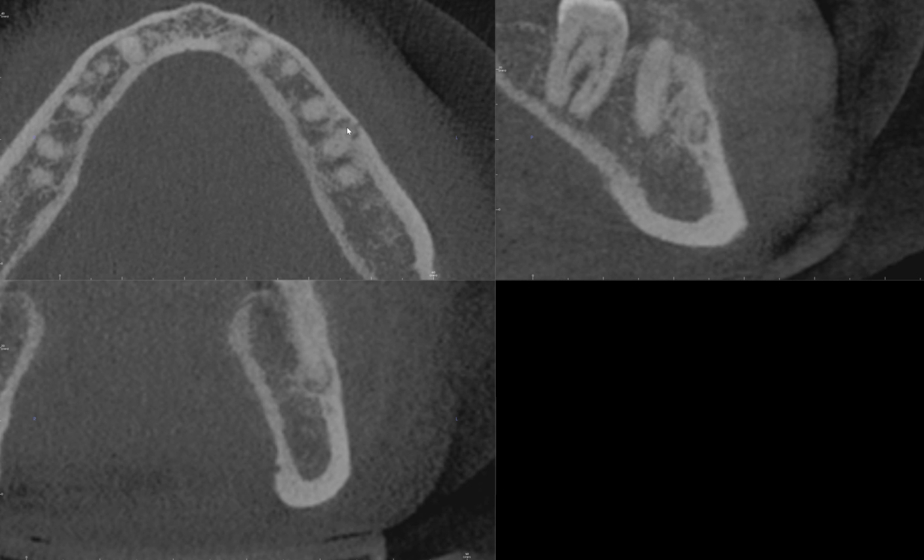Okay, no root resorption, no displacement, thinning of the adjacent buccal cortex, a radiolucent lesion now becoming a mixed density lesion over a year and a half, tooth tests vital, patient is still asymptomatic. Given the condition, I've essentially given almost all the information. What do you think this is? Another piece of information that you may find helpful is this patient is a middle-aged person. So based on that, what do you think this is? Love to see what you're thinking.